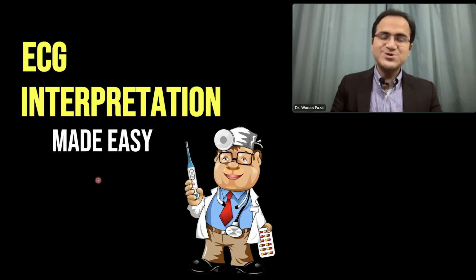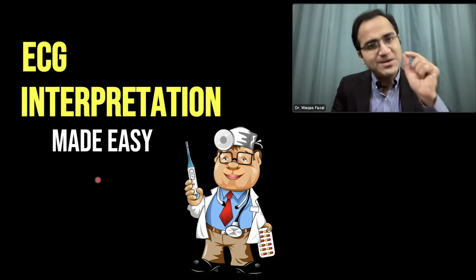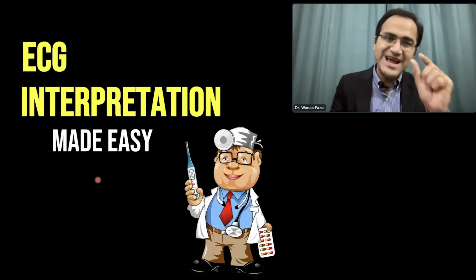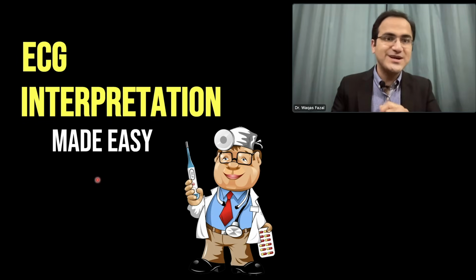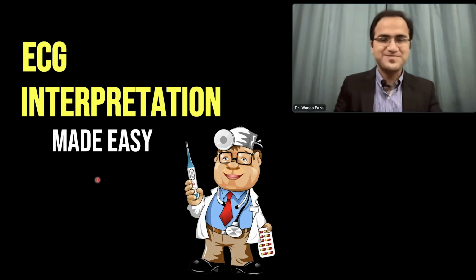Okay, welcome to the first video of the ECG Interpretation Made Easy video series. By the end of this video series, I'll make sure that you have mastered all the important ECGs, all the high-yield ECG rhythms and their abnormalities. We will solve ECGs together, we will learn ECGs together, we will interpret different 12-lead ECGs.